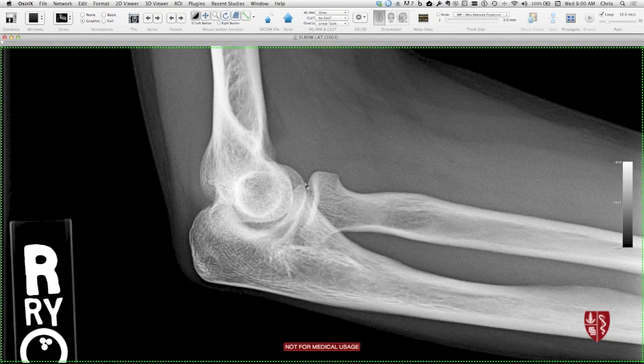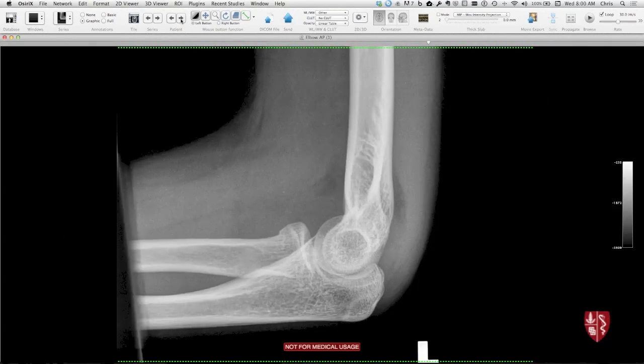This is a little bit of an oblique view of the elbow. You can see the radiocapitellar joint is here, and then the humeroulnar joint is here. And in the next patient, we had better views. Here's a better true lateral view of the elbow where you have the radiocapitellar joint, humeroulnar joint. The condyles of the distal humerus should be almost superimposing on a good lateral. So this is more typical of what you'd hope to see. Anterior fat pad, sail sign, and remember you can normally have an anterior fat pad in normal patients, but you shouldn't have that posterior fat pad, right? Remember, posterior is pathologic. And this patient just had a small buckling of the radial neck here.